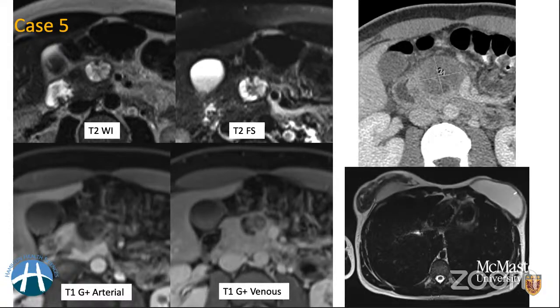So this is just the topmost slice of the MRI abdomen. You see the lower chest here, and just looking at this image, do you want to include anything else on your differential? You may have to think about what normal structures are missing here. Silicone implant rupture, okay. The implant was intact, but there's something else which is missing in this particular image.